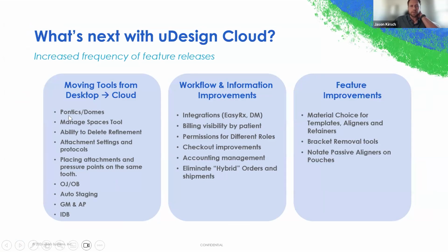Some of the tools that we're planning on adding are the ability to manipulate the pontics and domes. Right now, you can see them in the cloud, you just can't make any changes to them. So we know that's kind of high up on the list, and we're going to add that in pretty soon. We're going to add in the ability to manage the spaces. So those little point ones that we're seeing in the software, we're going to add a tool where you can just hover over that point one and click on an X to delete it and make it a little bit faster for you.